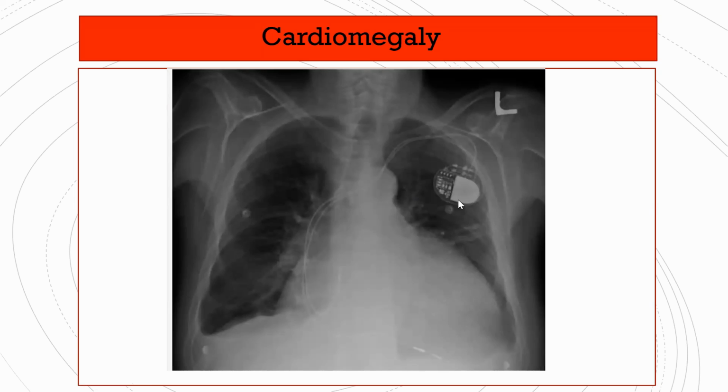Oh, as someone said in the chat, yes, pacemaker, very good. Oh, I hadn't seen, someone also said exposure earlier on. Great job, guys. So the pacemaker. And you can see the little wire going into the chamber of the heart. One wire goes into the atrium, and one wire goes into the ventricle, okay? You can learn about pacemakers in another lecture, probably.